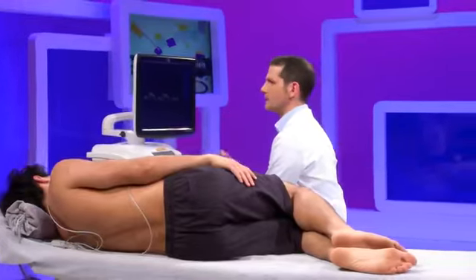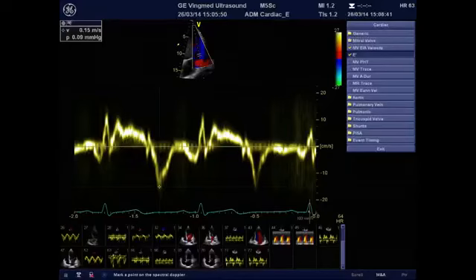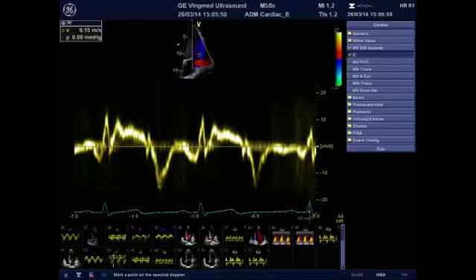This is important because then the cutoff values that we will use in order to say whether there is diastolic dysfunction or the level of filling pressures will need to be adjusted based on the site that we have used to record that particular wave. In this case, you saw there was the 13 centimeters per second E prime at the level of the septum, and here we have a 15 centimeters per second E prime at the level of the lateral wall.